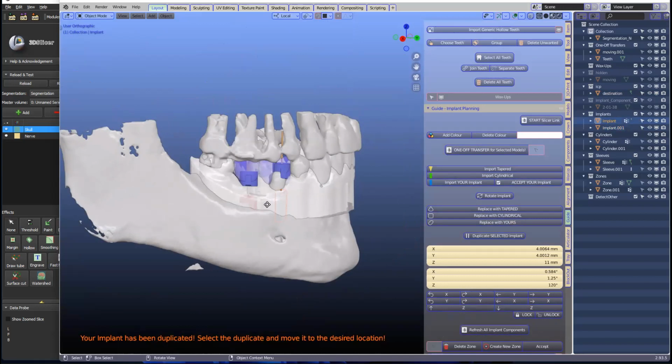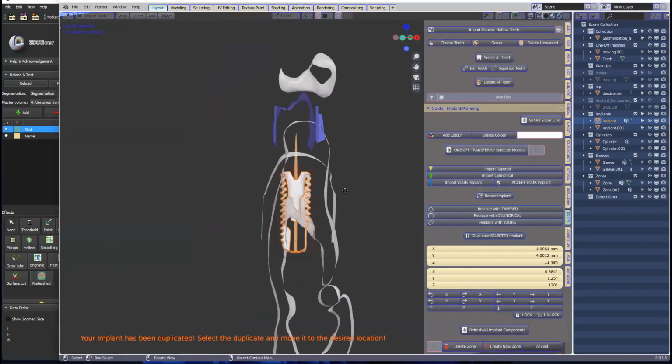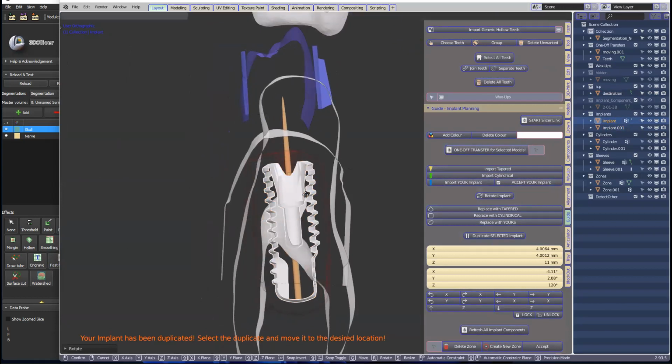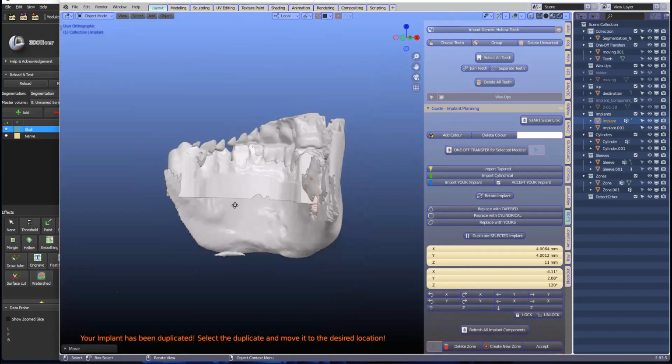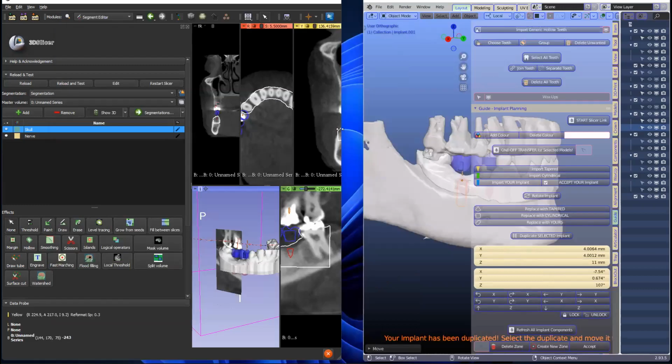So here again, Alt B, cross section, like that. We've got a little bit of a tooth there, which has been extracted, I've been told. Okay, so that's about it, and we will just double check this now. Okay, can you see my screen, Wolf?